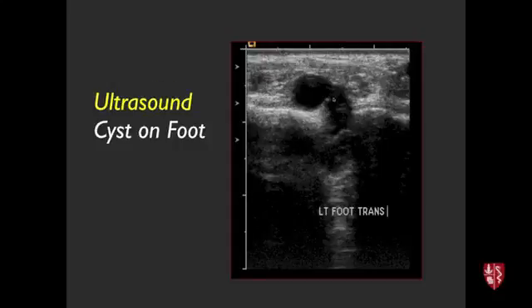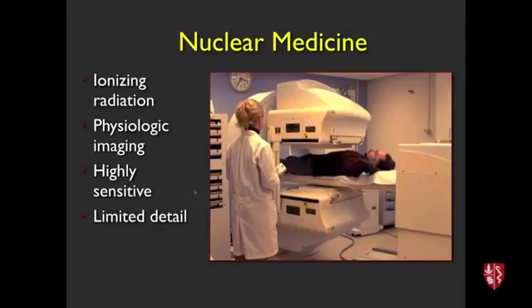The other thing one can do, if you're trying to decide solid versus cystic, is look at how uniform it looks internally. Does it look heterogeneous? Or you turn on color flow, and if something has vessels within it, then you know that it's solid as opposed to cystic. That's used a lot for things like cystic versus solid renal lesions, kidney lesions. Like, is this a cyst or is this a solid tumor in the kidneys? Because the kidneys get a lot of cysts in them.